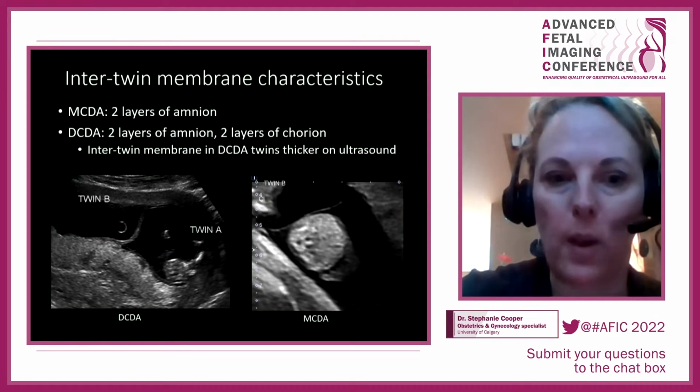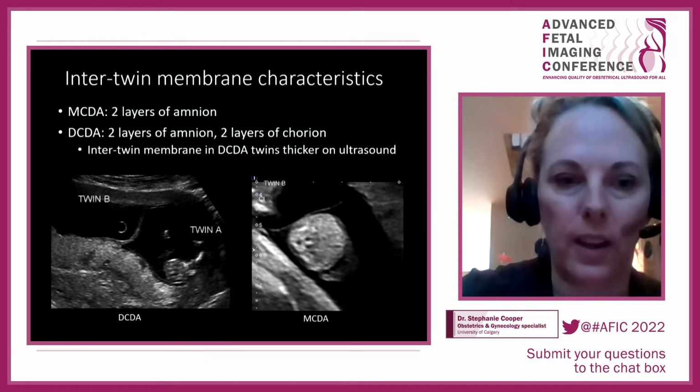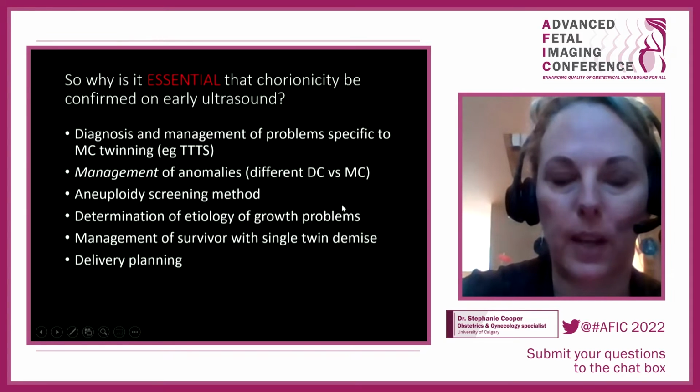Okay. All right. Membrane characteristics. This helps you decide as well, because there are thicker layers in the dichorionic twins. You can see it here, versus that thin, almost spidery web for monochorionic, diamniotic twins.